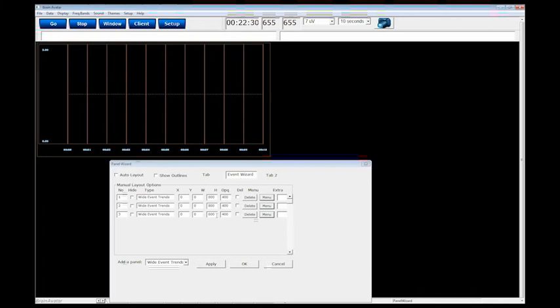Right where your cursor is, you've got 800 by 400, yeah. But it's in the right two boxes. Is that what I meant? Yes, it is. Let me just go with that. The 4 boxes go as follows: X coordinates, Y coordinates, width, and height.